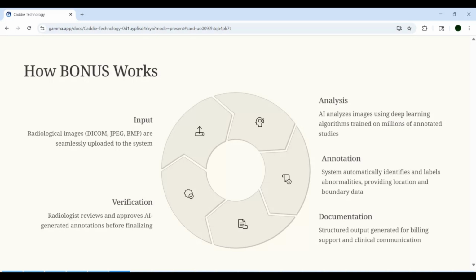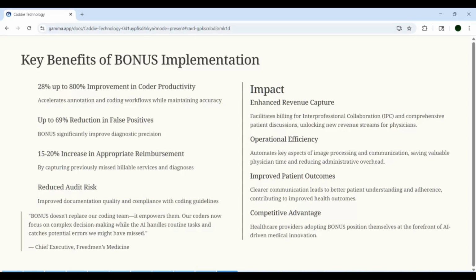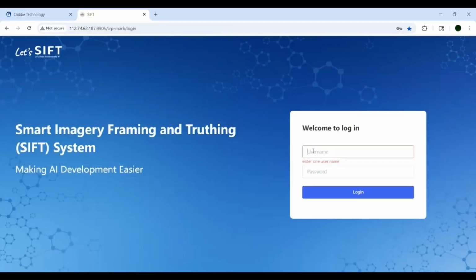decision-making. AI-assisted DRG (diagnosis-related group) coding with diagnostic imaging support uses artificial intelligence to analyze images and assign accurate DRG codes, streamlining the coding process and supporting correct hospital reimbursement. Let us start with a landing page where the user inputs their credentials for authentication. Upon successful login, users are presented with a dashboard displaying a list of existing projects in a structured table format.